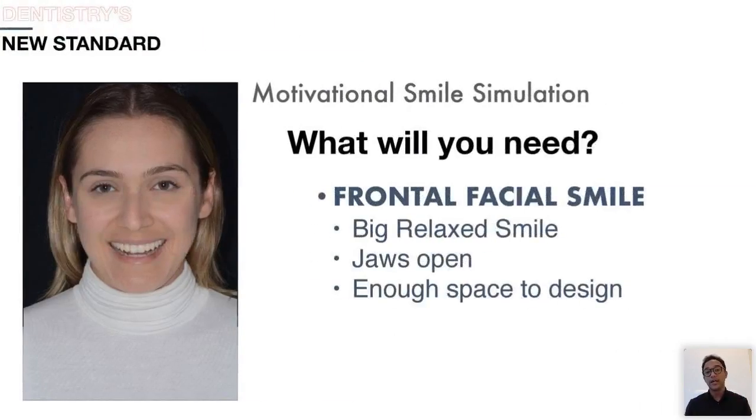And what do you need in order to create a smile simulation and create the facial analysis with it? You need only one frontal facial picture with the patient smiling. The jaw should be slightly open to have enough space to design.